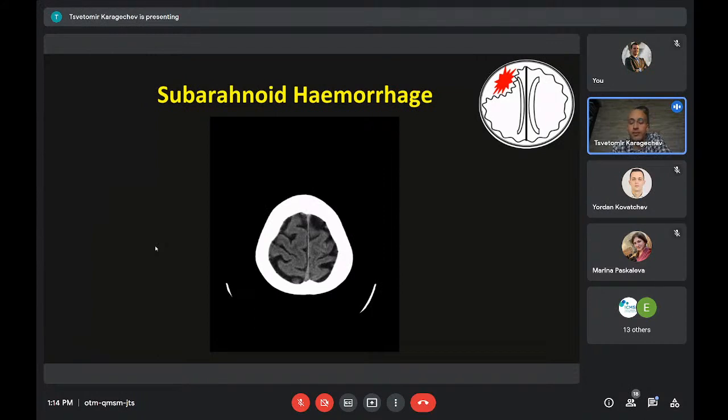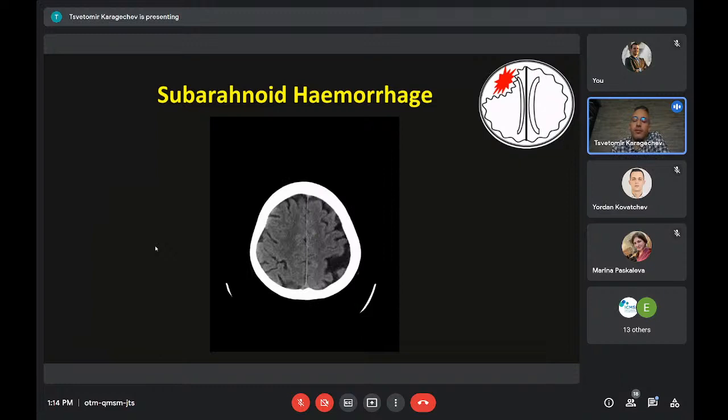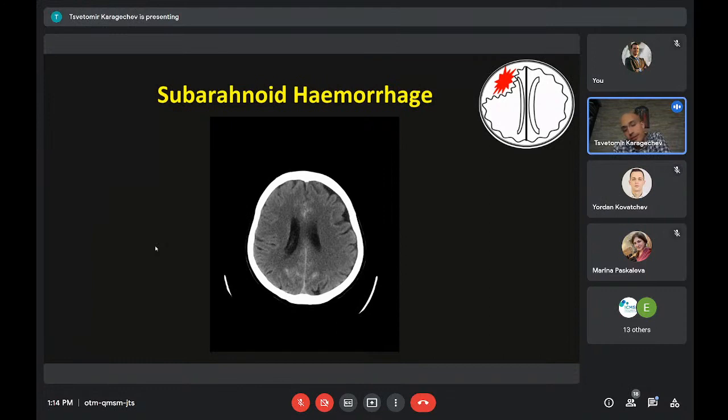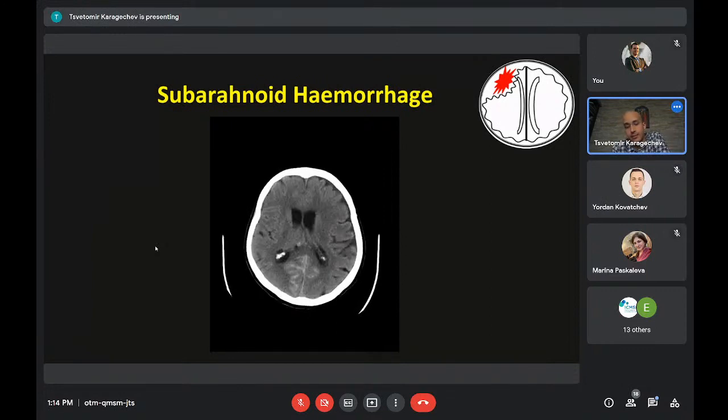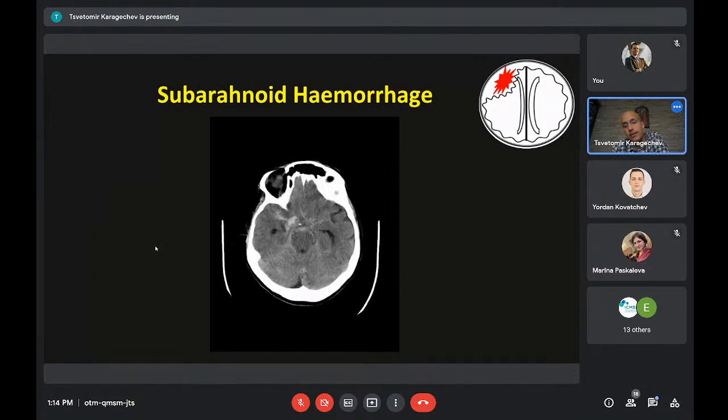This is really typical for these cases. So we start from the bottom, from top to bottom, and the very first slices they see actually completely okay. So nice great white matter differentiation. We see the sulci filled with CSF, and we tend to go down to the bottom. And here I'm sure that you already start noticing the abnormalities, this sulci pattern of hyperdensities, but it's not really dramatic, isn't it?